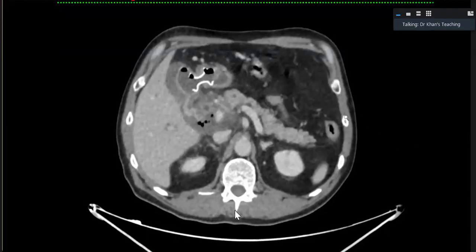Can you stop here? What do you think is this? And this is the procedure which was done. Over to you. So here in this region, yeah, okay.